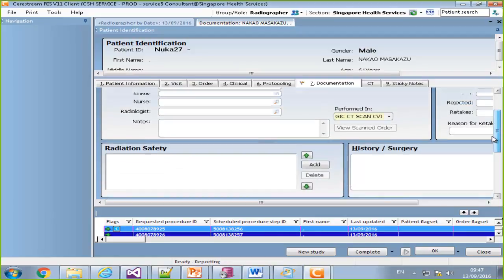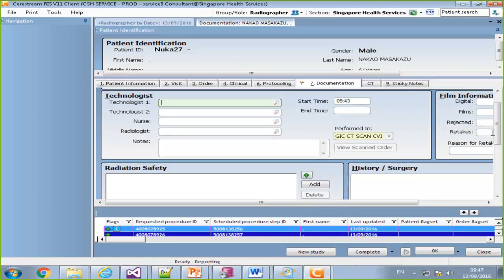And let's try to see. Should I show an example of the copy? Or not yet? Okay.